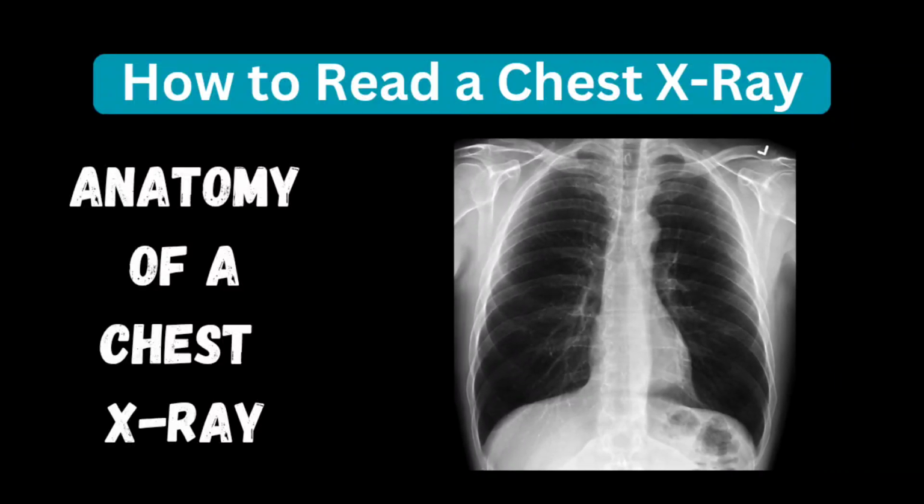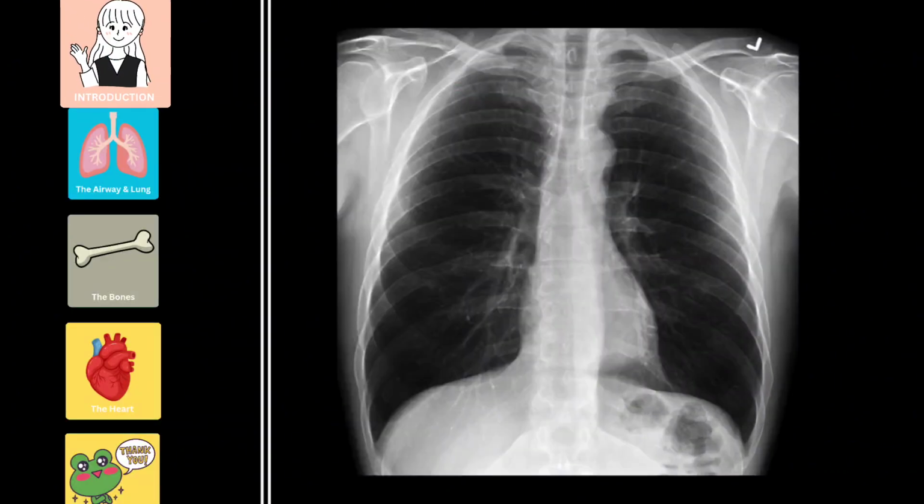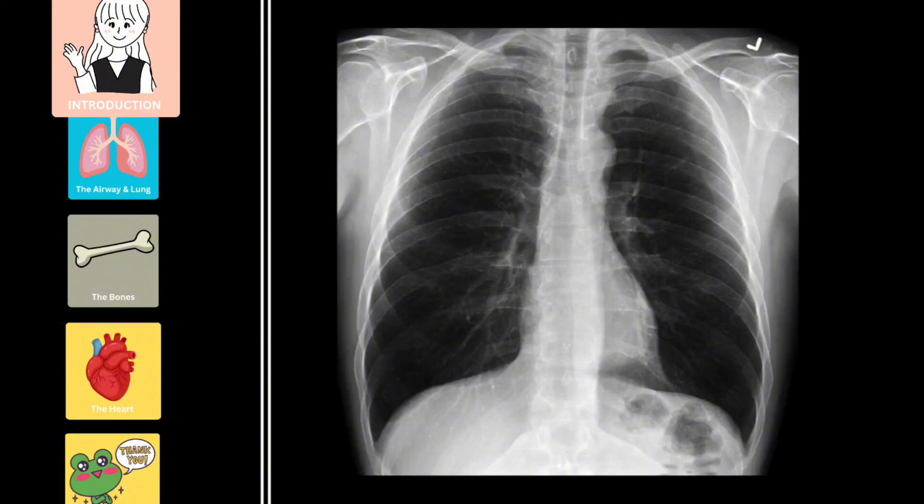What a normal chest X-ray looks like. It can look intimidating at first, but coming up with a systematic way of reading your X-rays can help simplify things for you. So, let's start with some basic anatomy that you'll need to know going forward.